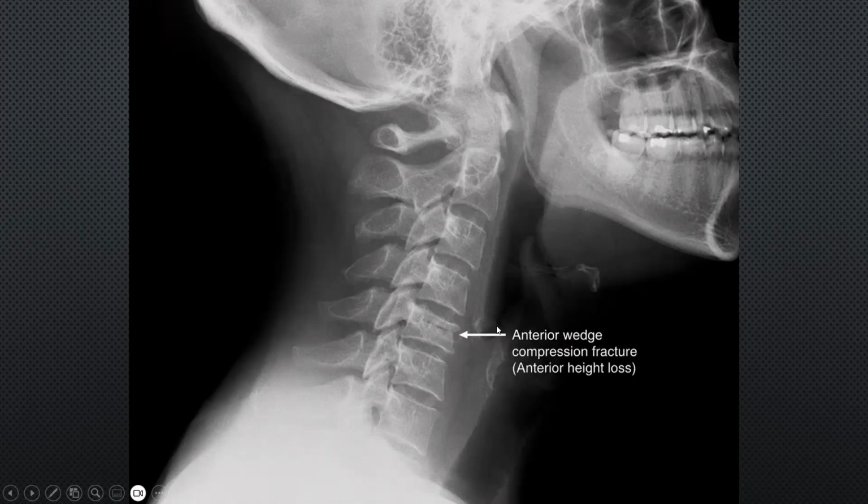So if you comment on everything, you will waste the time. If you say not accurate, adequate, and normal alignment, but the problem here is in the vertebral body shape and the height, you will waste the time. If you have one X-ray only, the actor is holding one X-ray only, take your time. But if he is holding, for example, 4 or 5 X-rays, don't waste the time. It will be obvious in front of you, right?